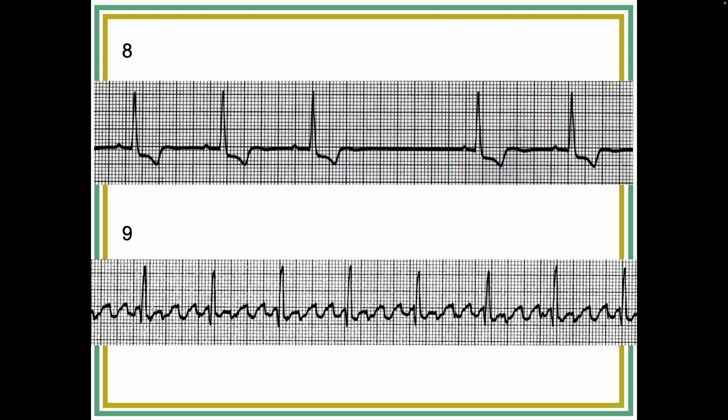You're absolutely right, though, in the sense of, way back when I said, what does the P wave represent? It represents atrial depolarization. Then it's a very logical question to say, well, aren't those P waves? And yeah, you could call them that, but I tend to call them flutter waves just to make clear what they are. So it's more of a nomenclature thing than anything.